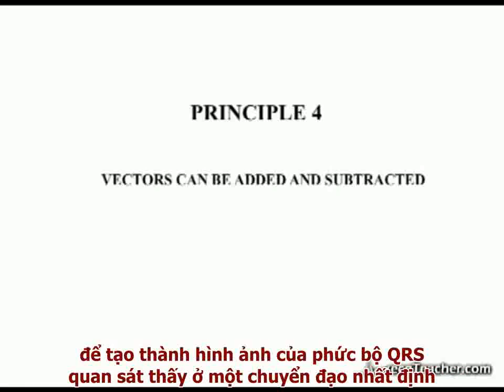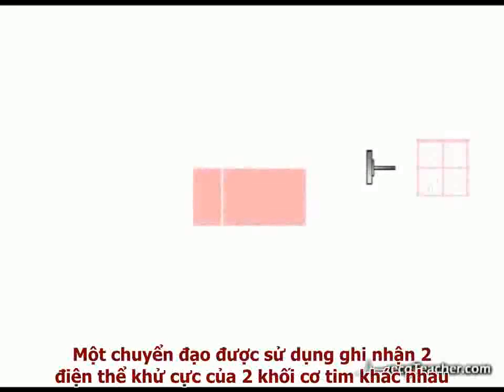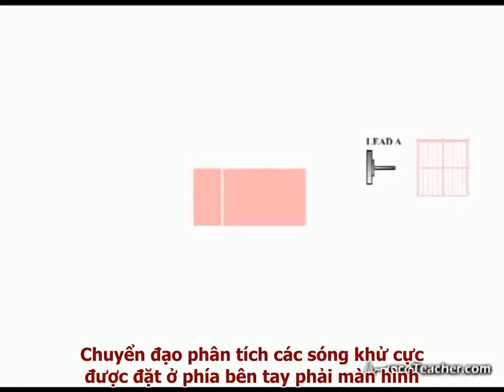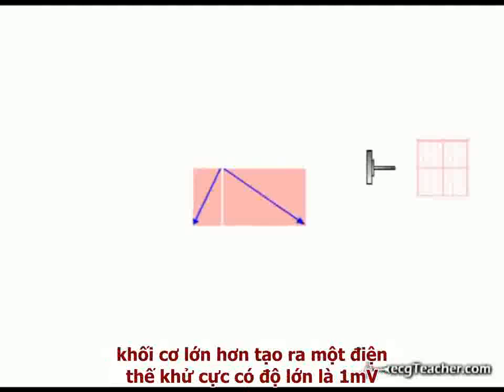a given lead. In the simple model shown here, an ECG lead is facing two pieces of ventricular myocardium of different mass and differing patterns of depolarization. The lead analyzes depolarization in the plane of the screen. The two pieces of myocardium depolarize at exactly the same time.